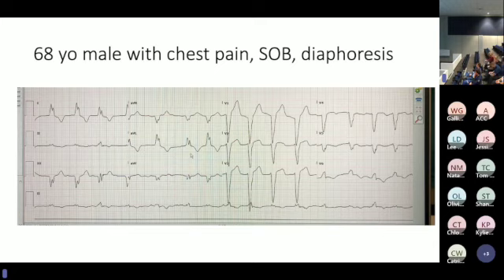You were nodding? So I think there's concordant elevation in the left leads. So I and aVL, I think, are Sgarbossa positive. Yeah, so I would call that discordant because we've got the QRS going up and then the ST depression. Does that make sense? Yeah. So in this case, I think this was just a left bundle. Does everyone agree or anyone disagree?